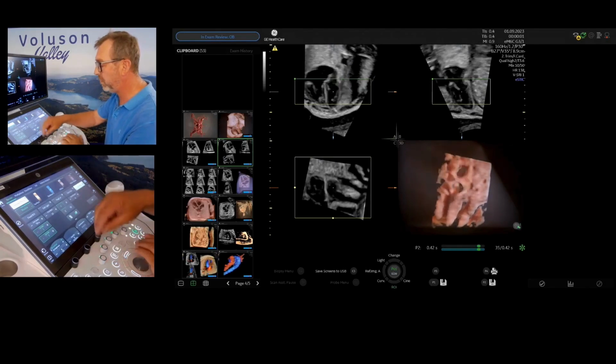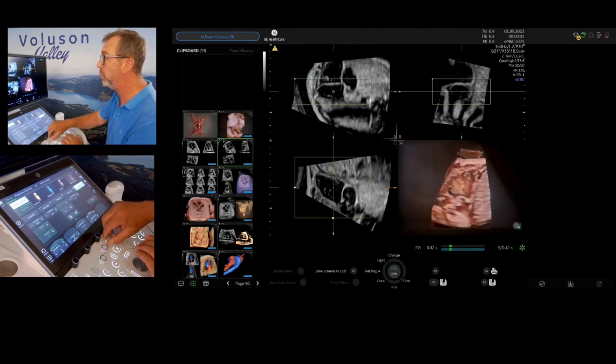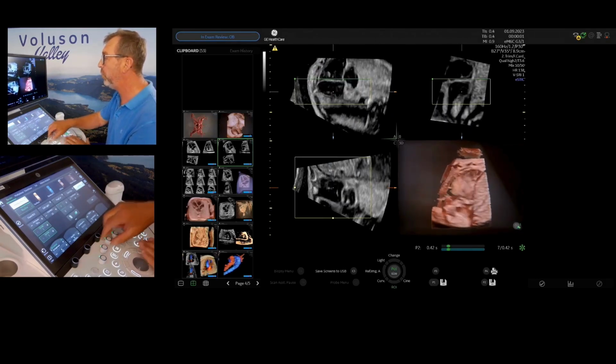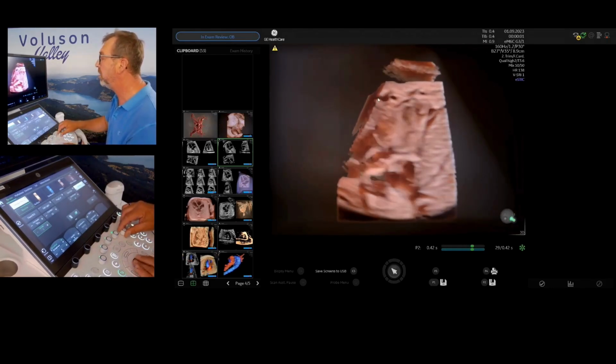And now I would like to demonstrate how to show the septum in the rendered image. You simply start to rotate again around the Z-axis and move your green line very close to the septum, and immediately you can see nicely the rendered image of the septum.